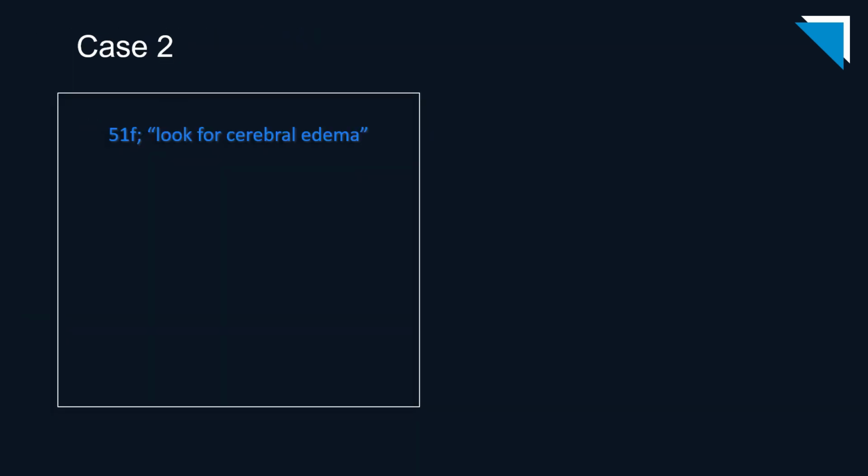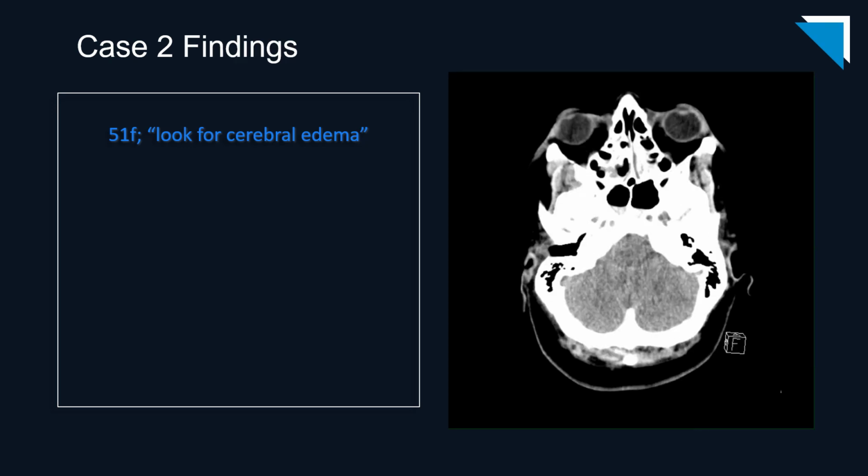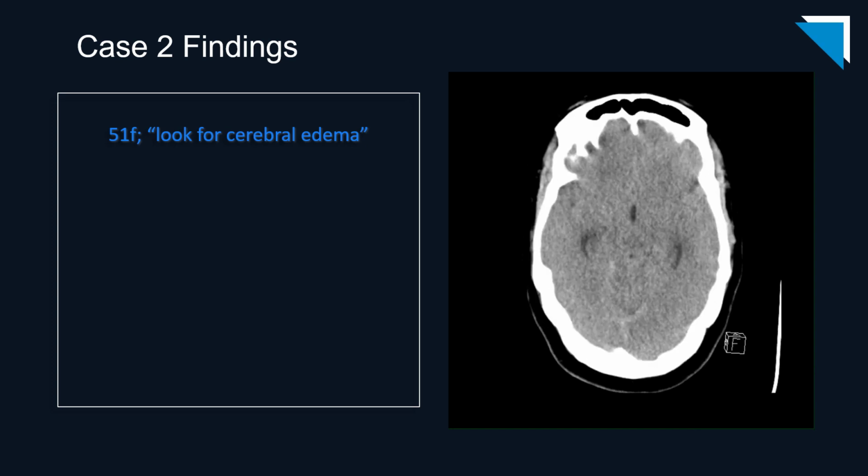Our next patient is a 51-year-old woman. The history is look for cerebral edema, which I assume is code for the patient is unconscious. Once again, we'll begin with the axial images from a non-contrast CT scan of the brain.